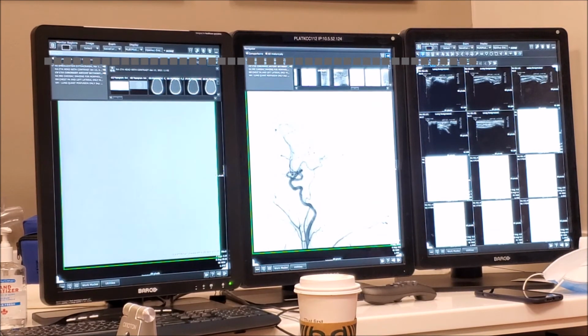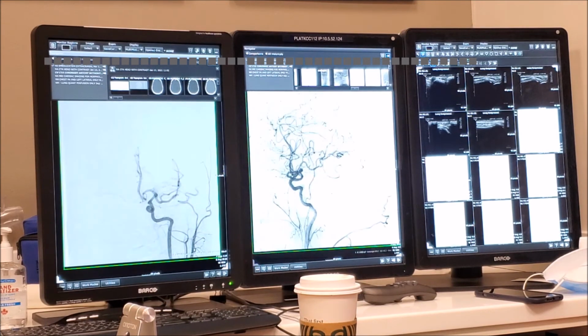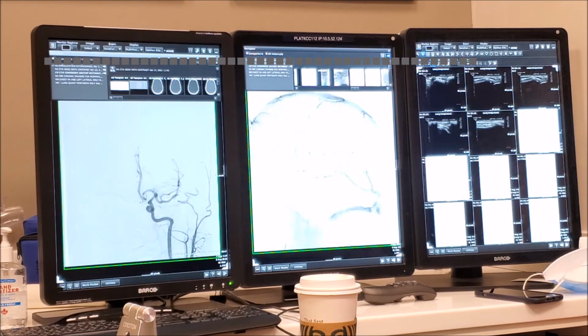So here we're missing the middle meningeal artery. And again, we have a difference with the ophthalmic. A small ophthalmic here, foramen rotundum, anterior deep temporal will go to lacrimal gland. This anterior temporal gets... There's a variation in the venous system too.